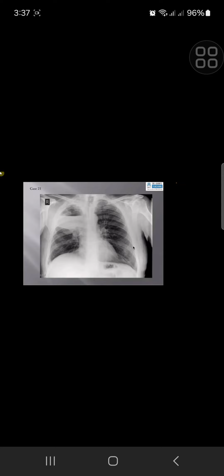If a patient has had a previous pre-existing cavity, comparison with the previous chest radiograph, if available, would be helpful to see if there was any pre-existing cavity. So, if it's a pre-existing cavity, sorry, what was the thought process? I'm not poking at you, just to get that thought process. What were you thinking? So if there's a cavity, what does that mean? How does that help in your differential?